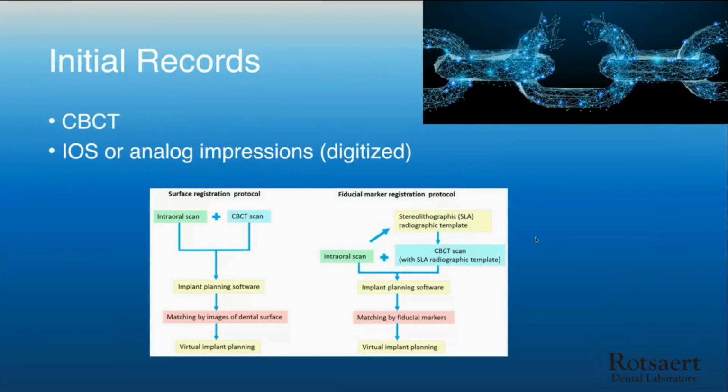So when we start looking at, okay, I've got a case coming up, let's use a single central as an example, or a lateral. We want to make sure that we have ideal placement. Where do we go from here? And we do a number of different designs for surgical guides. I'm going to talk about a digitized or digital workflow primarily today, but we also do what we would call analog surgical guides, which could be vacuform type guides with a denture tooth in place. It's more of a prosthetically driven surgical template.